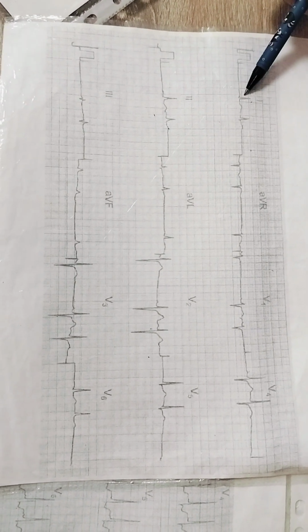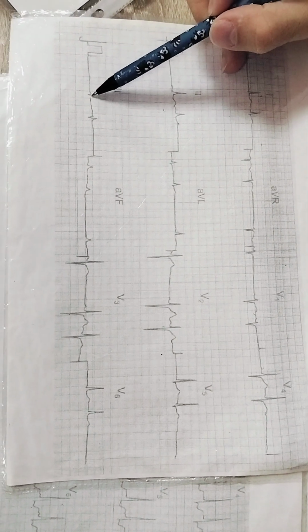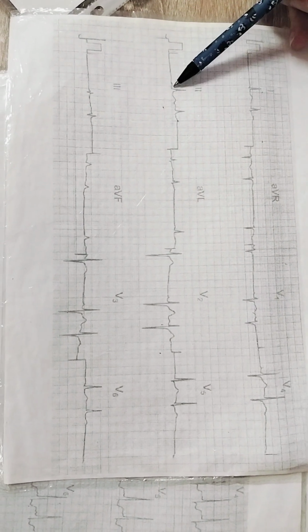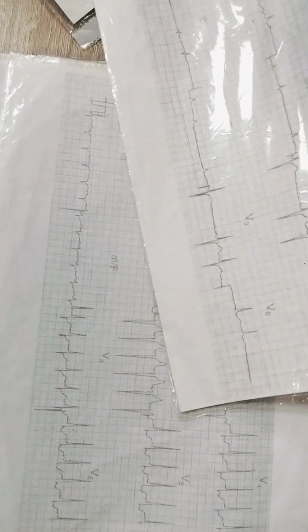Let's count some. I'm interested. 7 plus 2 more, 9. It's about 10. Maybe it's working.